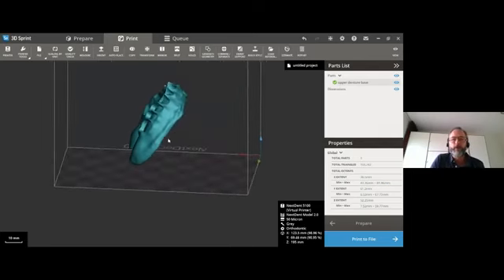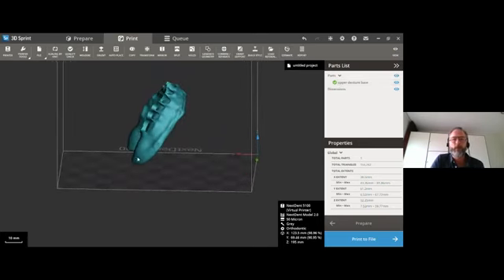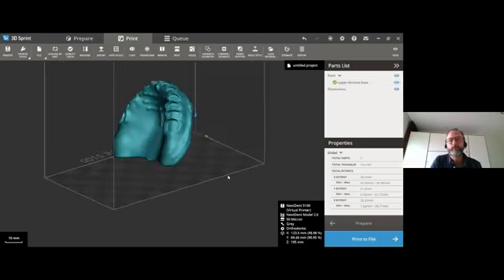A nice advantage also here is that if you place it like this, you can fit 4, maybe 5 dentures, depending on the size, in one platform, and make sure that everything is printed nice and accurate. Is this answering the question? I believe so. Very good. Thank you for all the information.